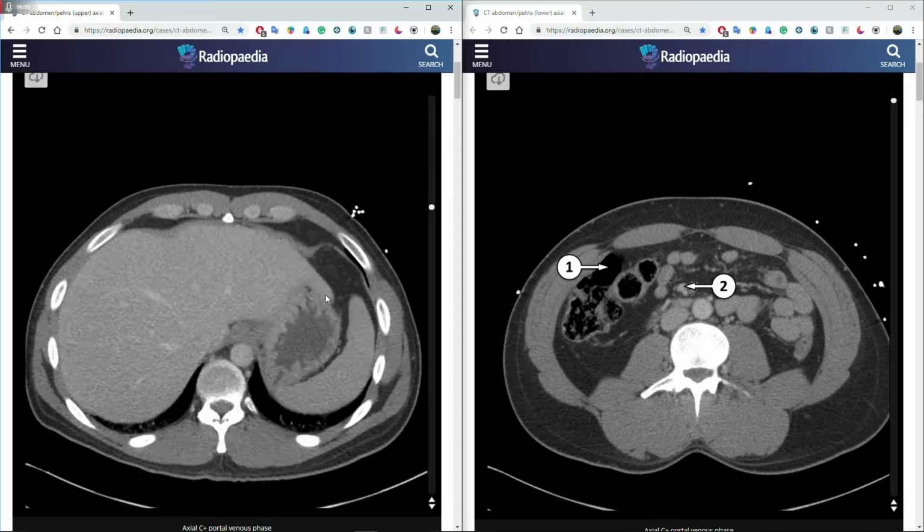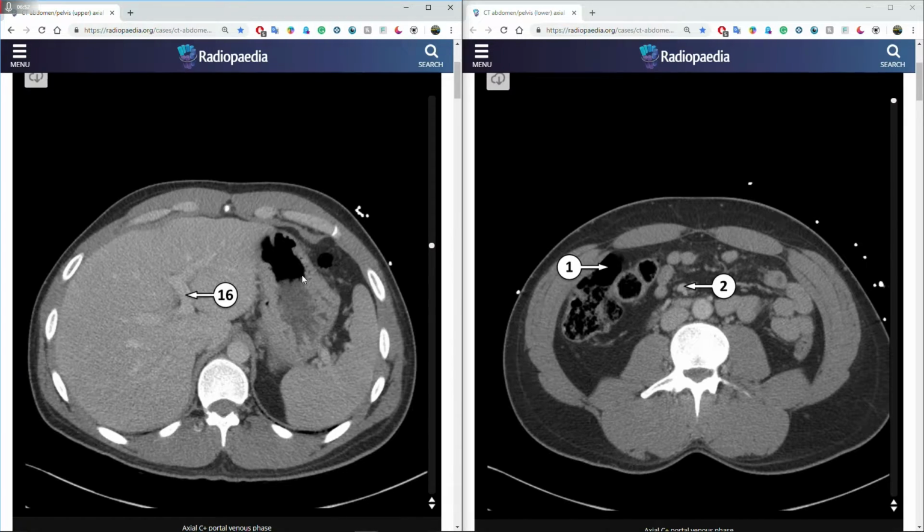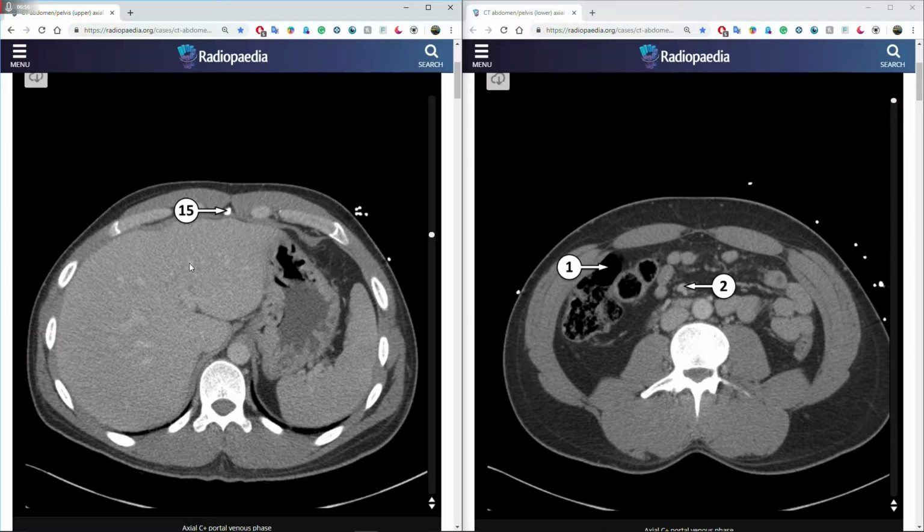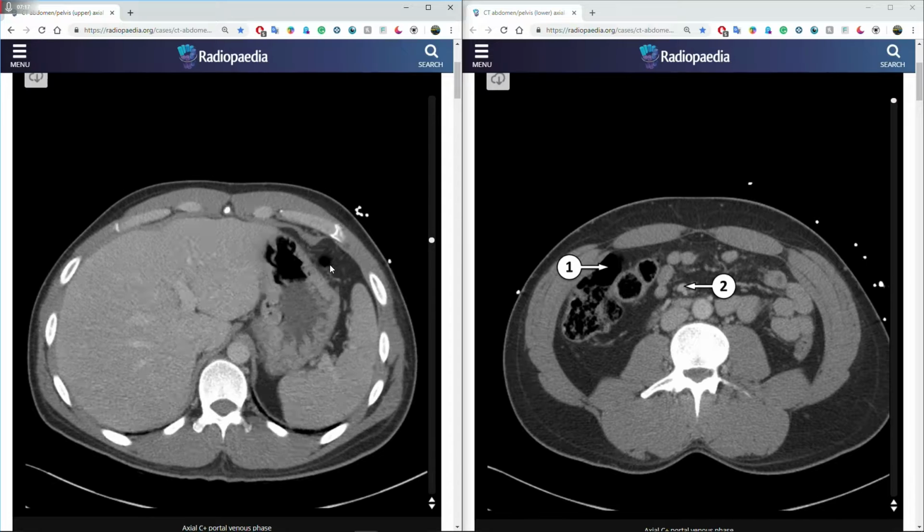as we descend and follow along with the stomach, you start to see the top of the transverse colon. So the stomach is more medial, and as we descend inferiorly, we begin to see the tip of the transverse colon, and remember on the left side it's called the left colic flexure, also known as the splenic flexure.